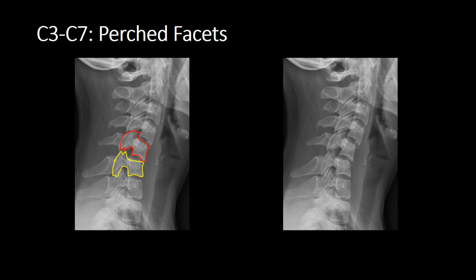There's a slight loss of joint space anteriorly at C5, C6, which isn't surprising as the facets have perched, but actually the intervertebral disc spaces are pretty well preserved. Look at our facets. These joints aren't actually too bad, although there's a rotation, we can see that there's an abnormal facet joint relationship at C5, C6, but the remaining facets are looking okay.